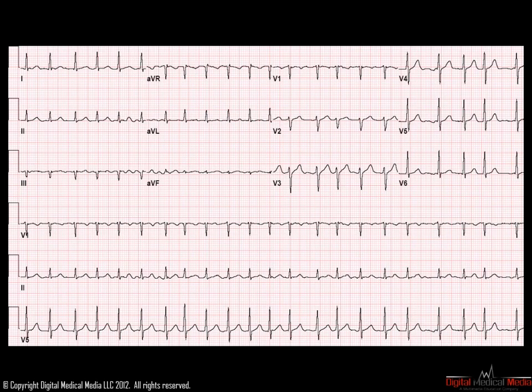Here is a new ECG tracing for us to examine. 300, 150. This heart rate is approximately 140 to 150 beats per minute. The R-to-R intervals are irregular across the ECG tracing, and there appears to be no repetitive pattern to the irregularity. We would suspect from the outset that this ECG represents atrial fibrillation with a rapid ventricular response.